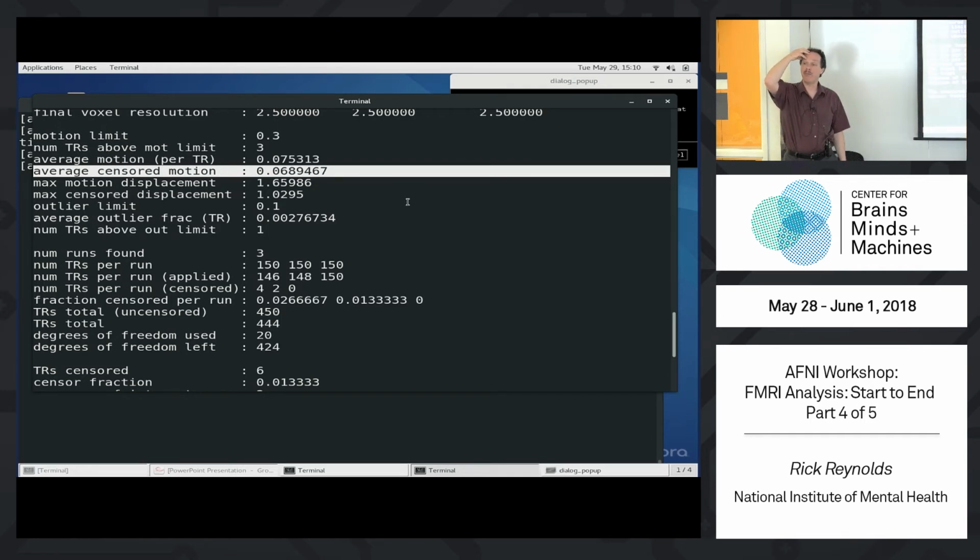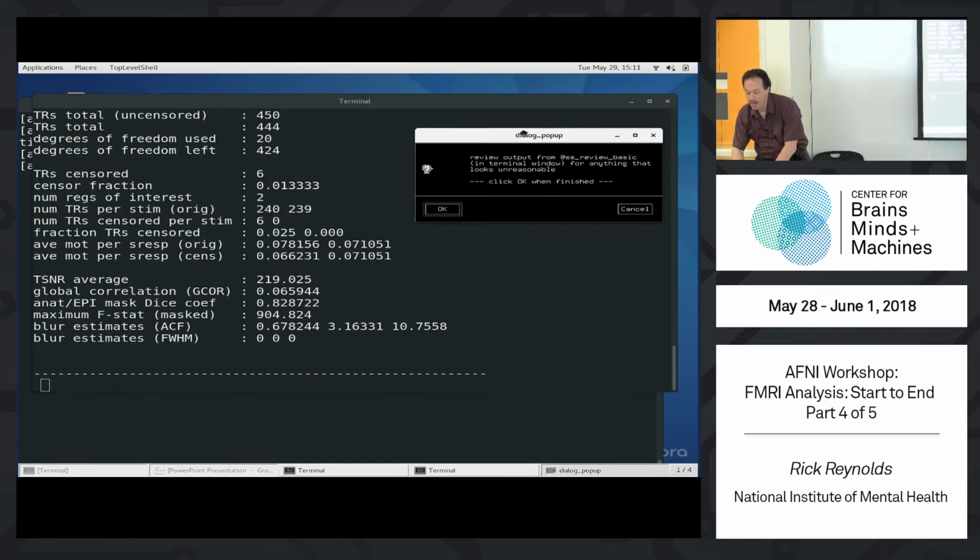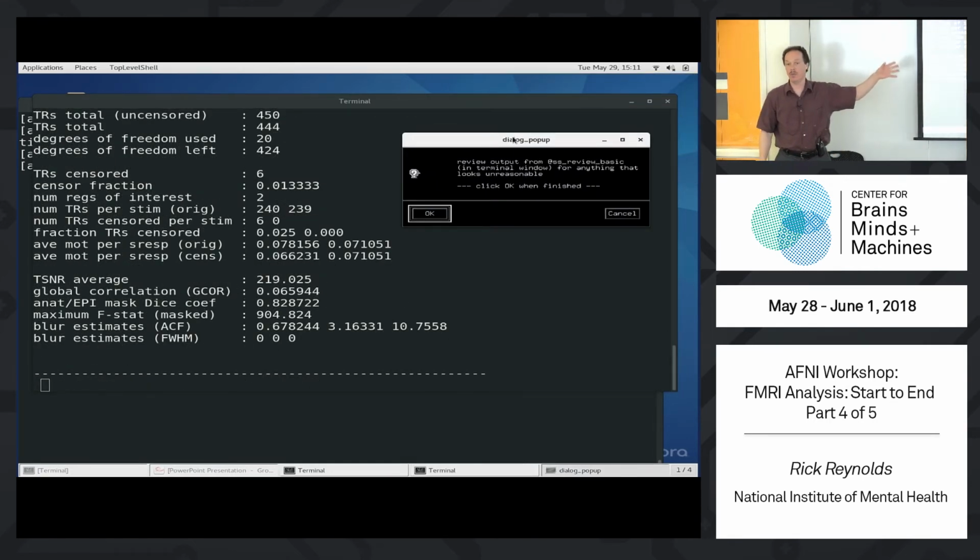If you get a big blob from that, that means you have a channel artifact, and a whole channel's area might be affecting the signal, and that's a concern. That program would make that more apparent. Anaticor, local white matter average regression, was done for that reason: to clean up the data so that you can still use it, assuming the channel artifacts aren't that horrible. Once we're happy with something, we can close the newly opened windows and move on.